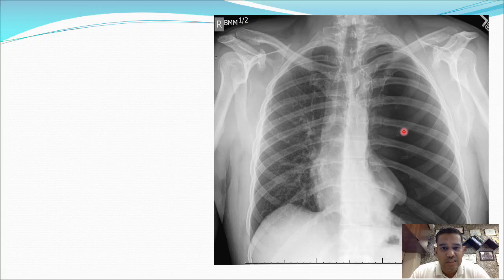You could see this. This is basically the costochondral junction, because your cartilage is not radio-opaque. It is radiolucent, so that's why you're not able to see it. You could appreciate this part is not visible beyond this, but this is the costochondral junction. This is basically B. The bony cage appears to be normal to me.